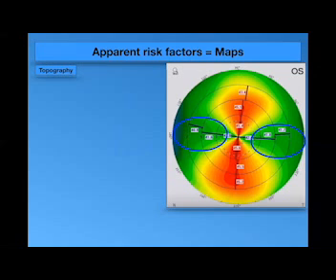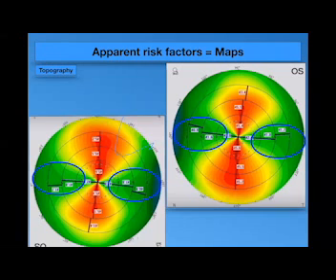We missed it. The corneal skewing is a very important sign to suspect keratoconus, abnormal topography. The skewing in this topography, which is shown in the slide, is a perfect typical one. The vertical one is steep. The horizontal one is flat, and the angle between the vertical and the horizontal is 90 degrees. It is a perpendicular angle. It is the normal astigmatism with the rule.